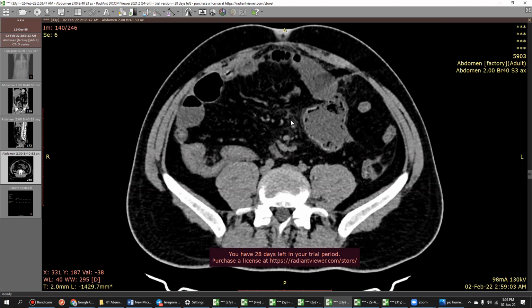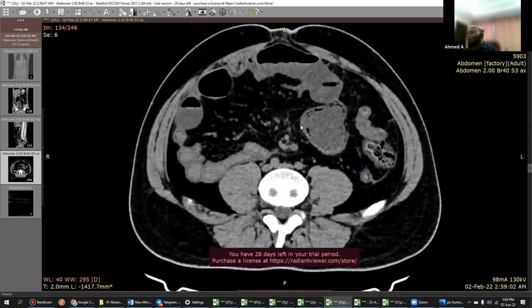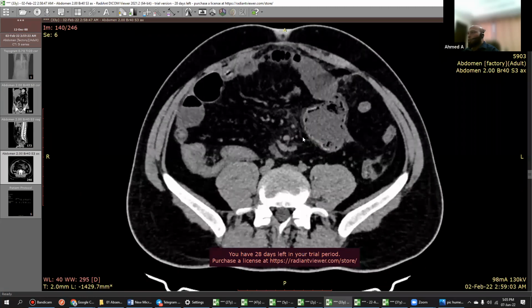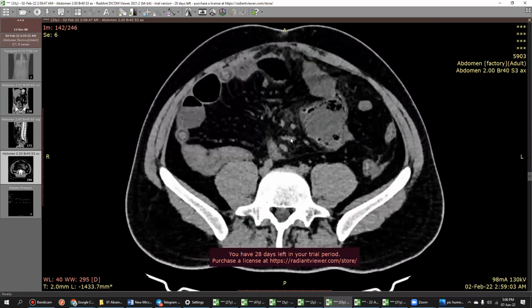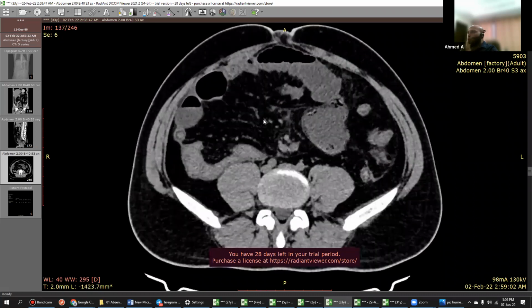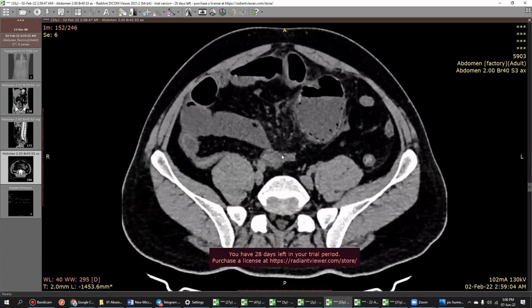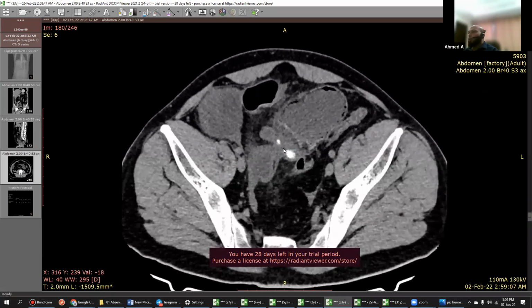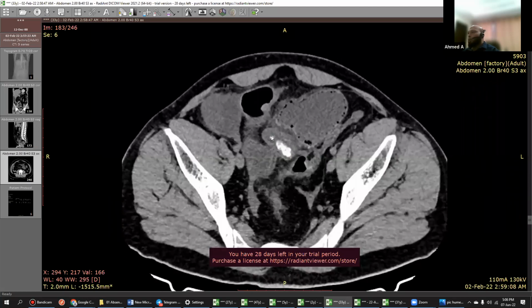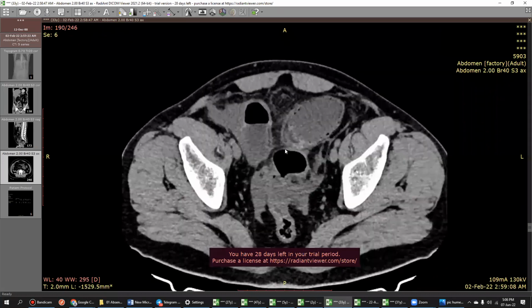Terminal ileum pathology, Crohn's, whatever pathology you know of the bowels, most of them are located in the ileocecal junction, especially in the exam setup, or in the rectum or somewhere. So always, whatever plain or contrast, go for the ileocecal junction. I'm trying to develop just the approach. If you had that approach, you would never have swayed and would have saved time. Now where is the appendix? This is the appendix. This is an acute appendicitis with a large appendicolith. The inflammation is all because of the appendicitis which is going on there.